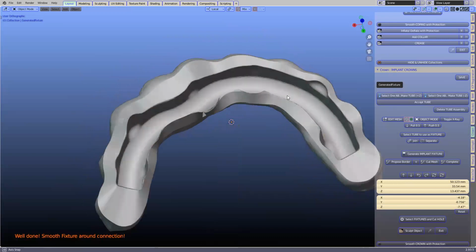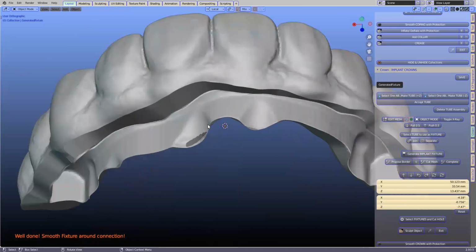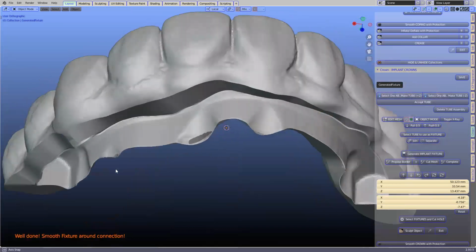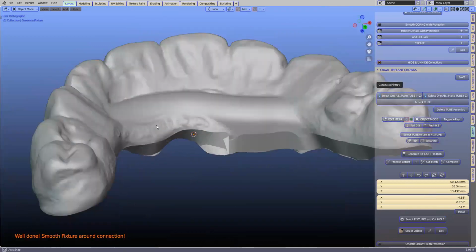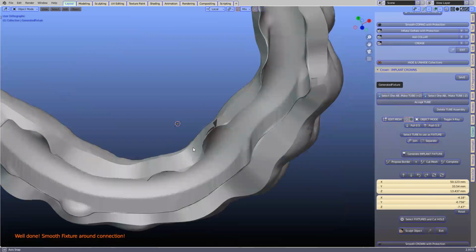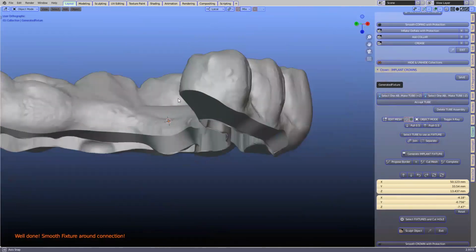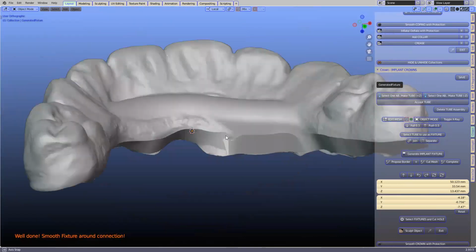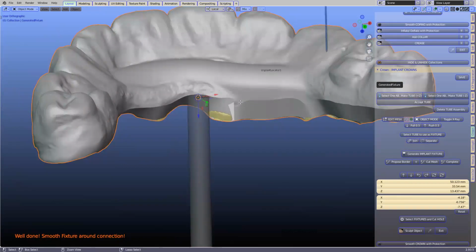Here is our, can you put a matcap on, Michael? Yeah, there's something going on here. I've got to still check this. It's quite a long way to jump, but yeah, it has fused here. There's a bit of a mistake, but typically we could go a few steps back and then pull that border down a little bit.